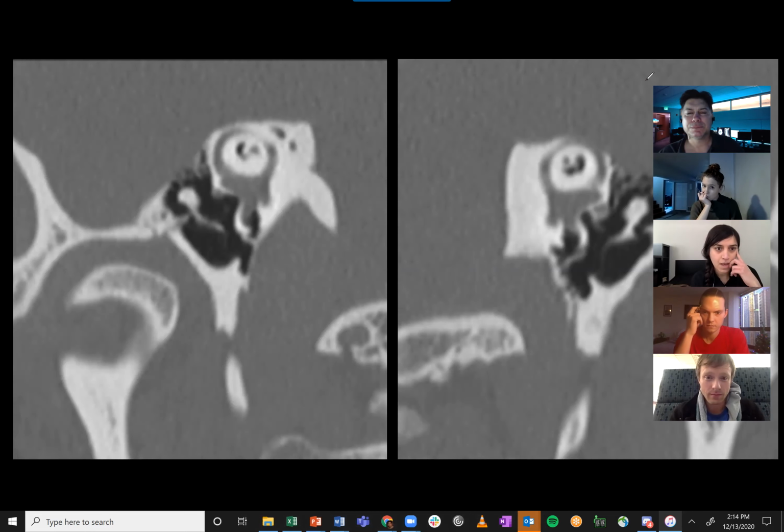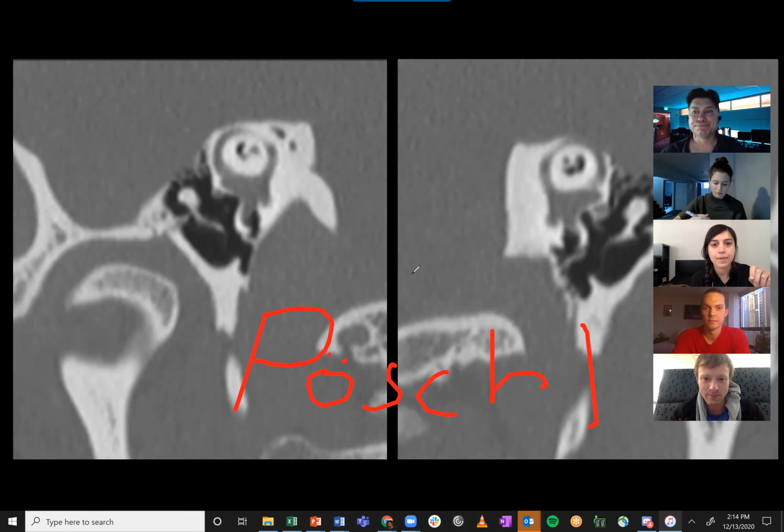Okay, so we are looking at temporal bone. I think these are either sagittal or, yeah, they're an oblique, weird sagittal kind of view, the Poschl view. Poschl, is that right? That's right, Poschl. Short axis or Poschl if you love to name stuff after dead people. So the Poschl projection, if you do these, is kind of a short axis. Yeah, it's like parallel to the superior semicircular canal. That's right. Which is that one. And you're showing dehiscence of it on the right screen picture there. That's right. So you've lost the bone over there.